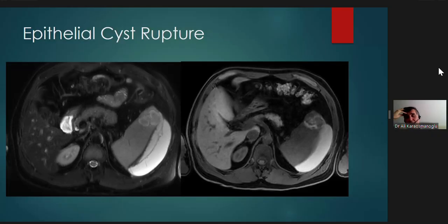Although you really don't consider angiosarcoma here, because primary angiosarcomas are rare, 1 in 1 million as far as I know, and at the time of diagnosis they're mostly metastatic, right? They're highly aggressive, biologically really aggressive. But we really couldn't rule out a lymphoma or some other malignancies.